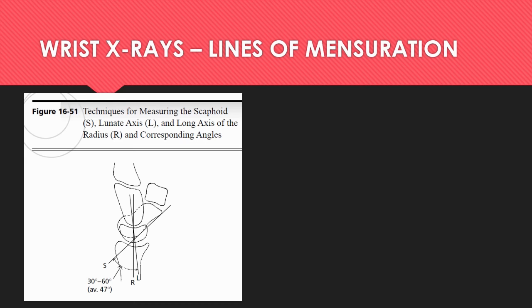So here is the dorsal pole, and here is the volar pole.